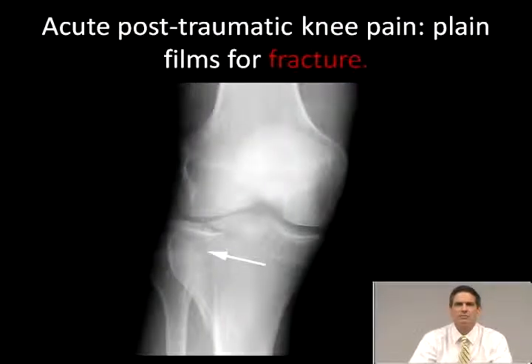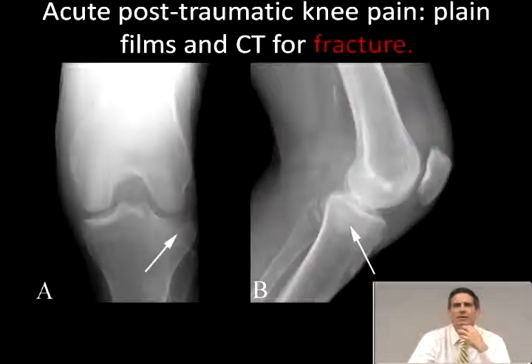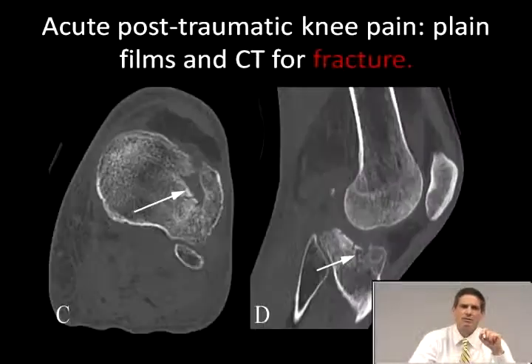The knee joint is the same as the other joints in the injury, plain film first. So what are you going to see with plain films? You can see obvious fracture, like this case. Sometimes the orthopedic surgeon, as in the case of the shoulder joint or any other joint, can order CTs for fracture fragment configuration evaluation.